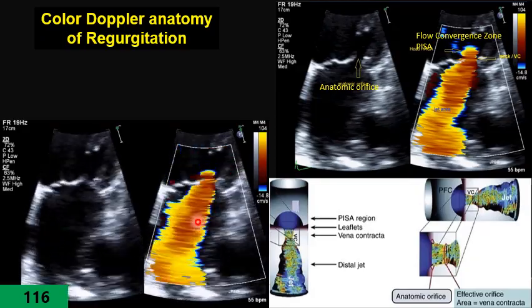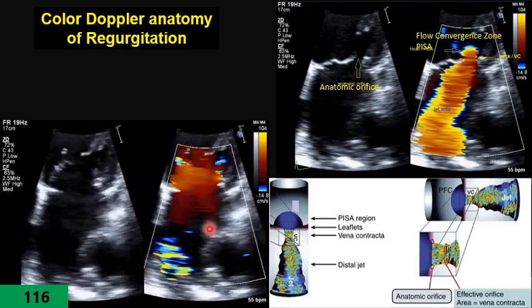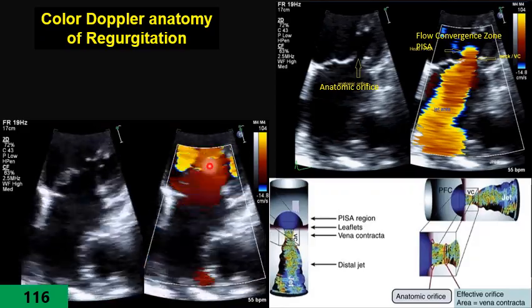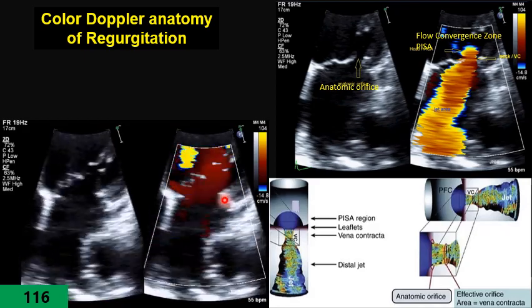After the neck, we have the jet area. I want to emphasize one more time, because we are dealing with that problem, that the blood flow pattern in the heart, especially in the areas of the orifice, jet, or stenosis, has two types of pattern, at micro level and macro level.